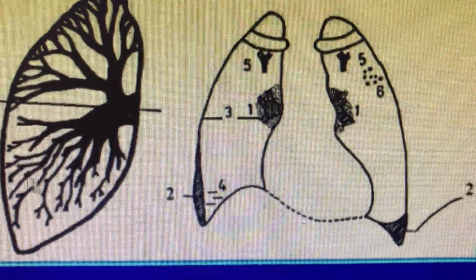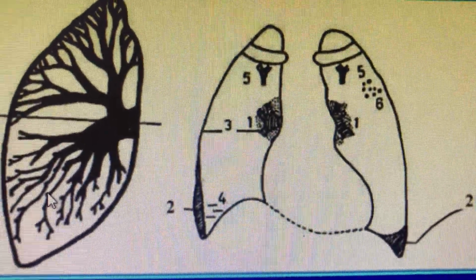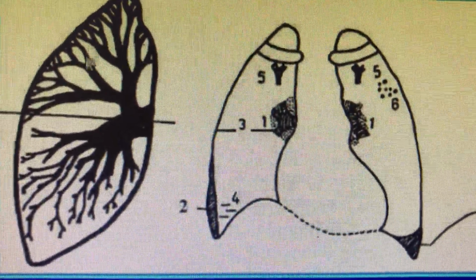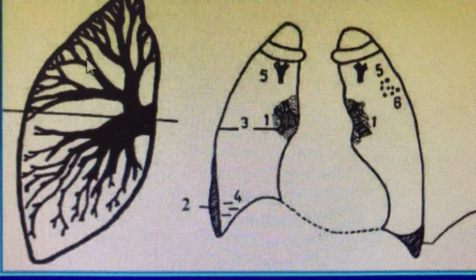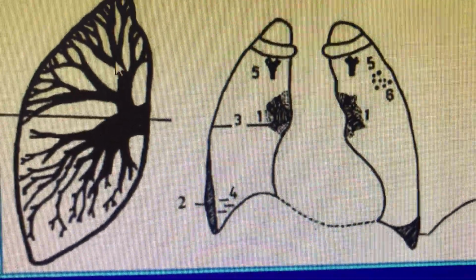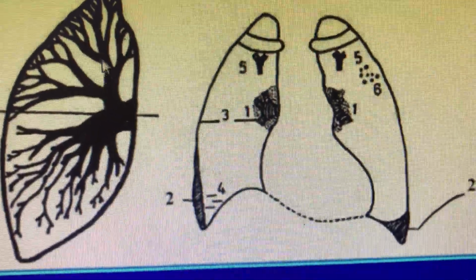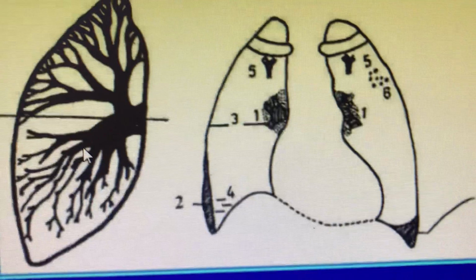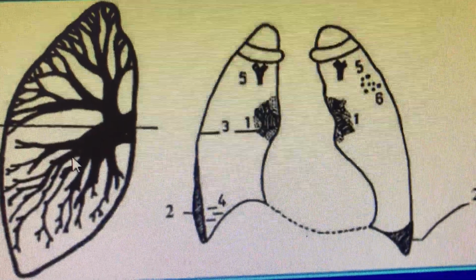So slowly what happens is, because of the increased backward flow in the venous circulation, vasoconstriction occurs in the lower lobe because there is more venous congestion in the lower lobes. So reflex vasoconstriction causes an increased pulmonary venous flow in the upper lobe. That is what is seen here. There is a reflex vasoconstriction and an increased pulmonary venous flow in the upper lobe, and this is what is called cephalization. This is the early stage of any venous congestion.